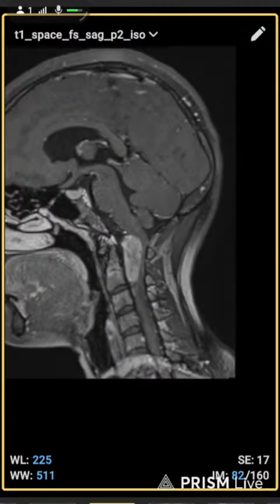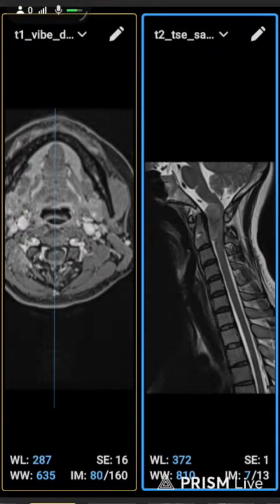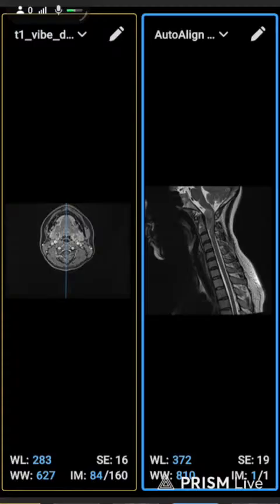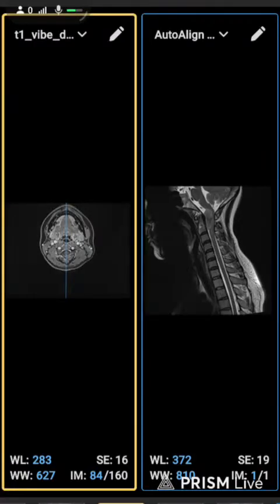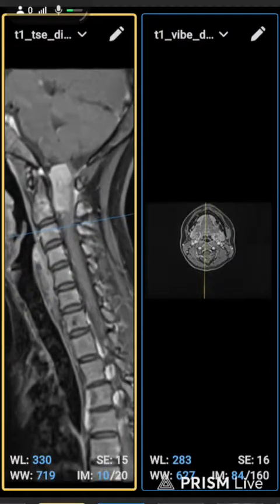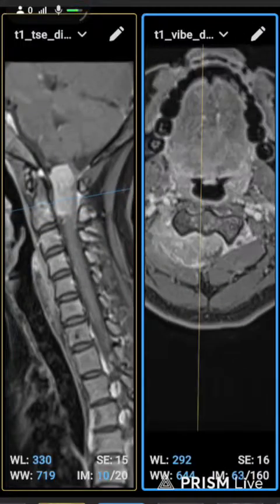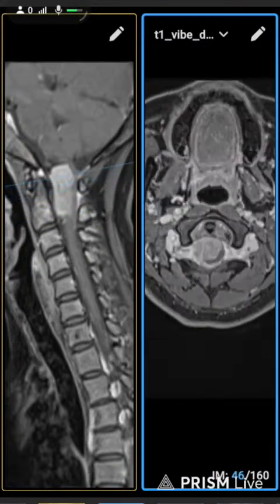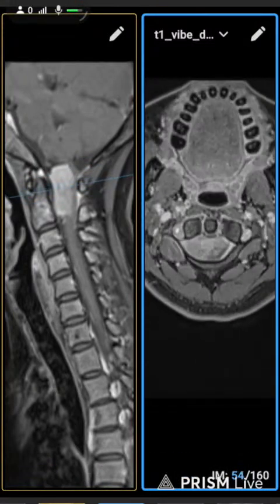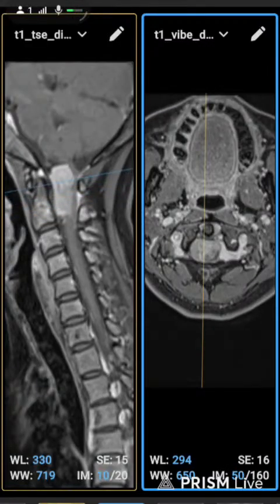And it's the most rare case I show you in this video. So we try to, in axial, we find out more detail than any other sequence like sagittal or coronal, just because mostly we scroll axial images.